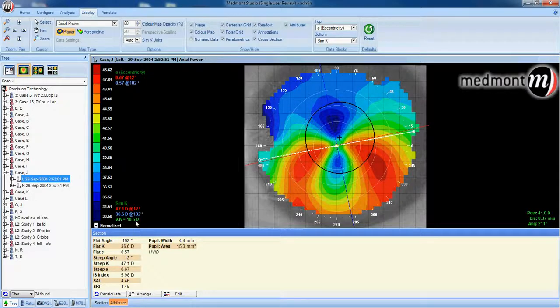The corneal astigmatism for this patient is measured as 10.5 diopters. This is an exceptionally high corneal astigmatism. We see a very flat K and a steep K. Having the flat K axis against the rule, axis 102, may be a good indication with the high corneal astigmatism and the asymmetrical appearance of the image that this is a pellucid marginal degeneration patient.